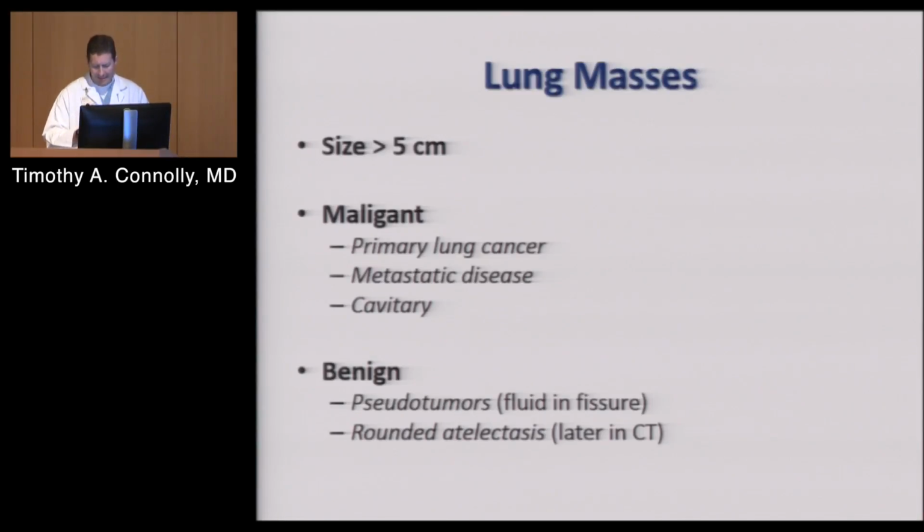In terms of lung masses, obviously big consolidative soft tissue tumors within the chest can be malignant, and that's our primary concern most of the time. It can also be some benign processes. So I want to make sure you guys see what this looks like.